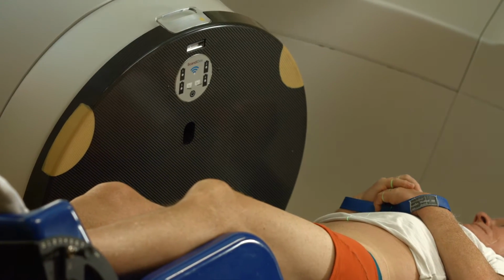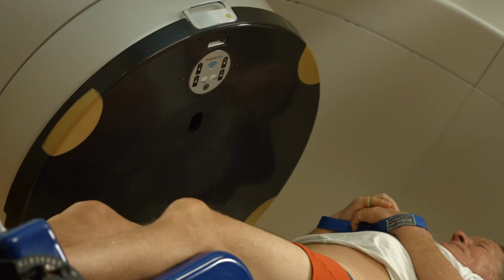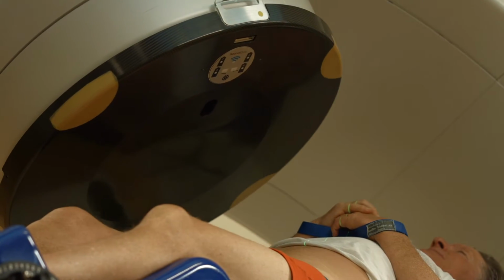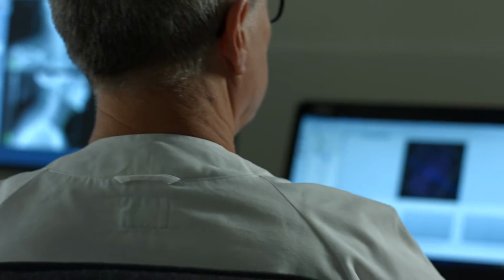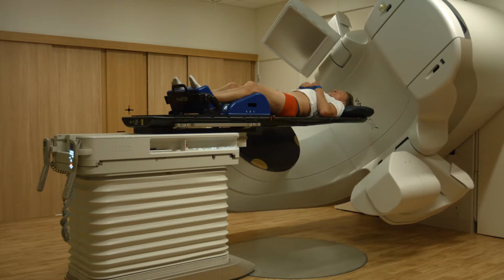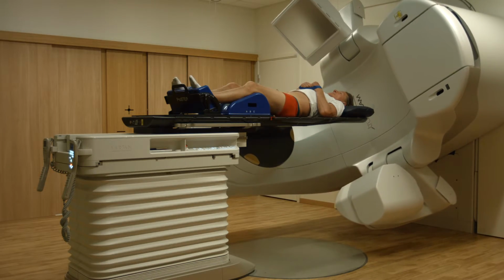During the following treatment sessions, the radiation during treatment and the position of your tumor are monitored and compared with your treatment plan daily. This allows revisions to be performed if the tumor changes its position or size, or if changes to your weight occur. You will then receive a new, revised treatment plan for the coming radiations.